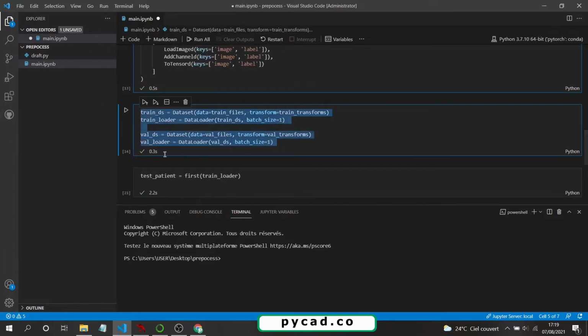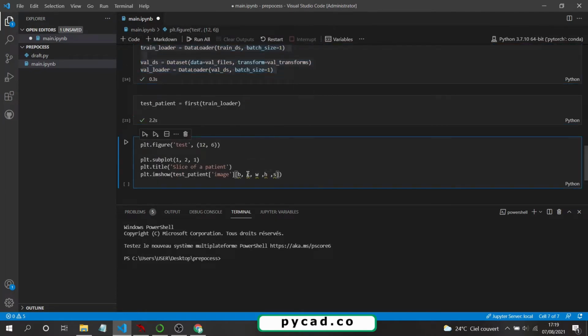When it loads data, it will create a new channel for the foreground and the background. Now, as I told you, the first dimension is for the batch, the second is for the channel, which is the foreground or the background, and these are for the width and the height. For the batch size we have only one. The index of the first item in an array is 0, because we always start at 0. If I put 1, it will give us an error, because 1 means the second item, but we have only one batch, so we should put 0.